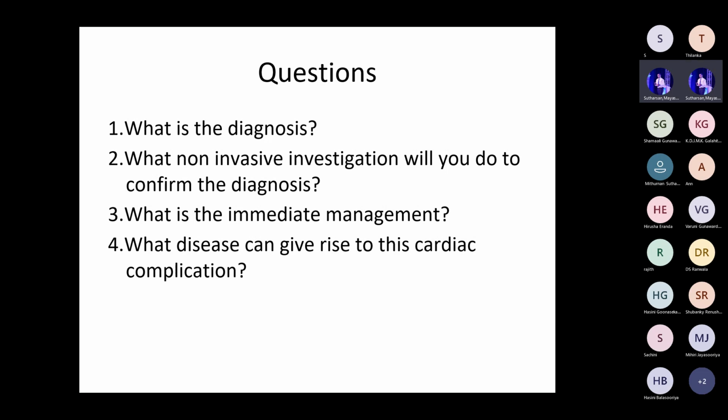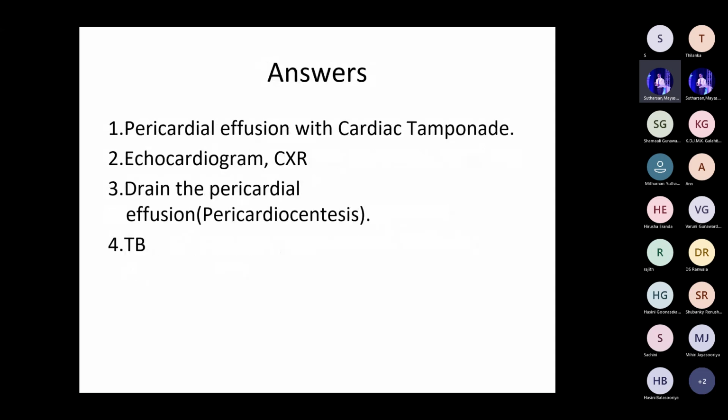What else? Will malignancy present like this? No. A connective tissue disorder like this? No. Right? It's TB infection. Of course, this, you know, right?